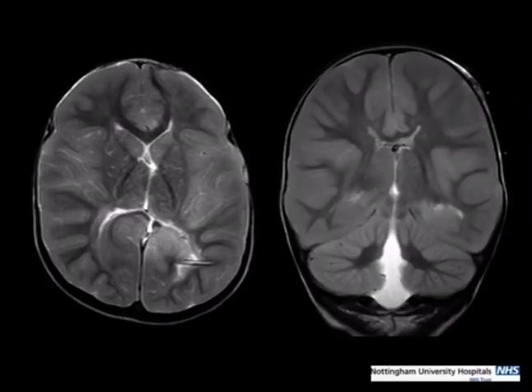In children, we tend to do a lot more MR in cases that you might consider hopeless on CT, and they're just as hopeless on MR, unfortunately. But clinicians are much more keen to have formal documentation of just how hopeless things are. This is a really awful hypoxic ischemic injury that happened in the community. Again, unexplained cardiac arrest. There's a shunt in situ from a previous neurosurgical problem. And there really is diffusely abnormal signal in the cortex, compression of the ventricles.